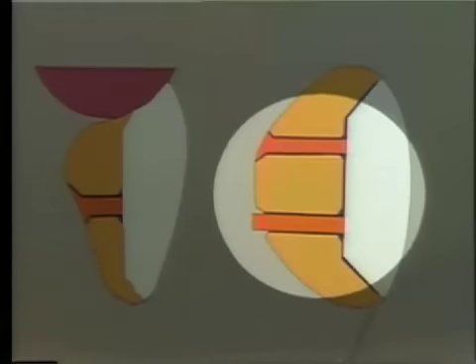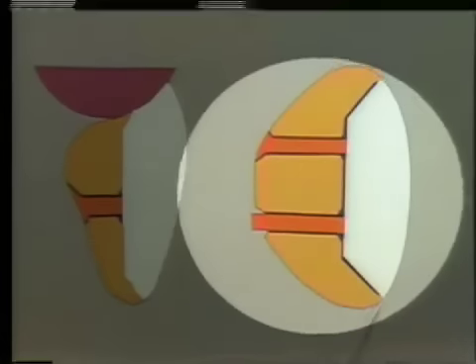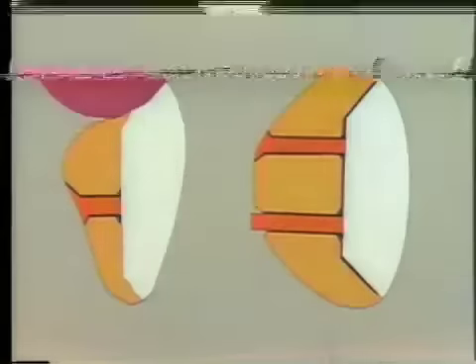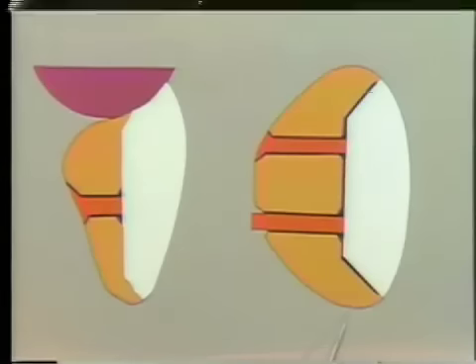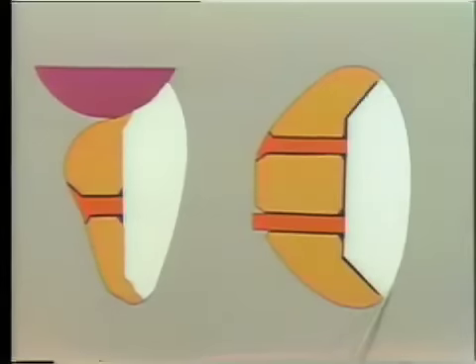The porcelain is beveled so that the gold comes forward and meets the porcelain on the labial surface here, and the same is done on the other side. This gives the adequate amount of gold here for the contact relation, for making the soldered connector, and the position of this is quite strategic. If it gets too far forward, you will show much gold in the mouth.